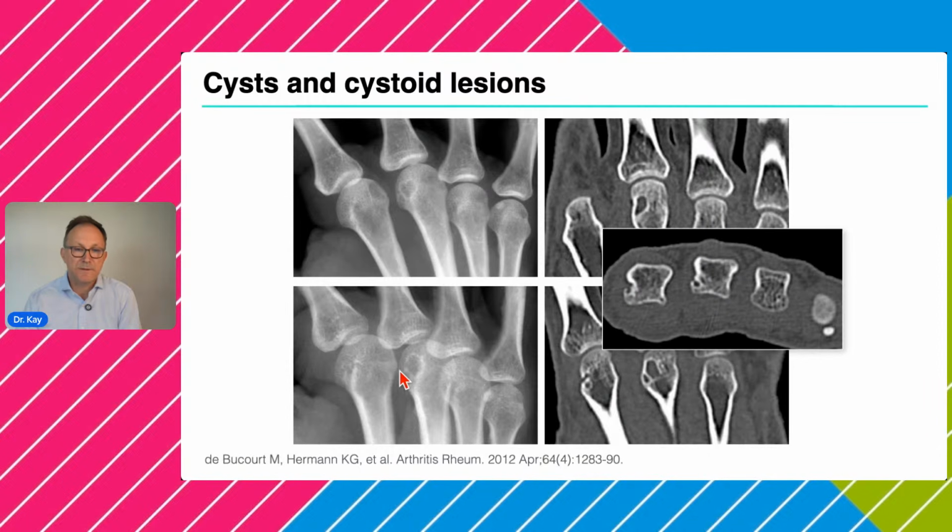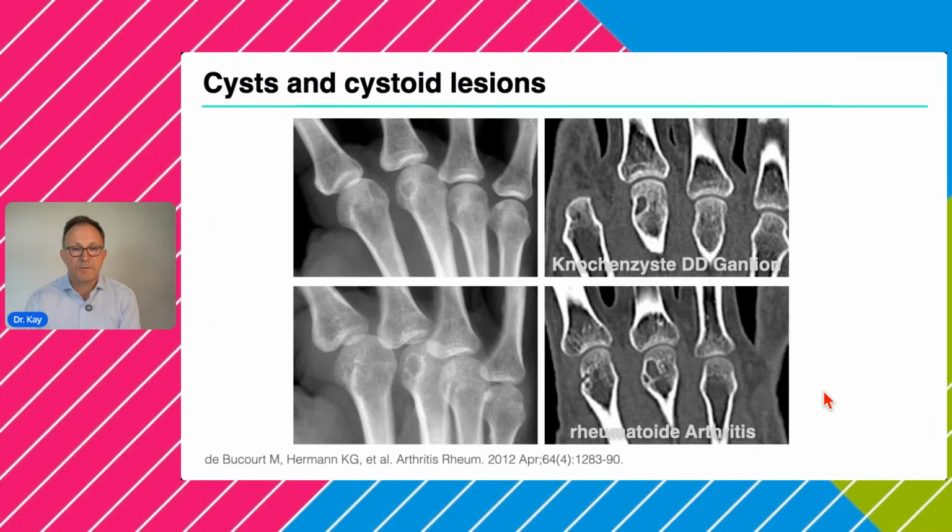So these cystic changes, if you see them either in the posterior-anterior projection or in the oblique projections, they are important because they are not giving you the full proof that there's an arthritis, but they give you an early sign that maybe you perform an additional MRI scan or ultrasound of these joints because they are at risk for erosive damage.